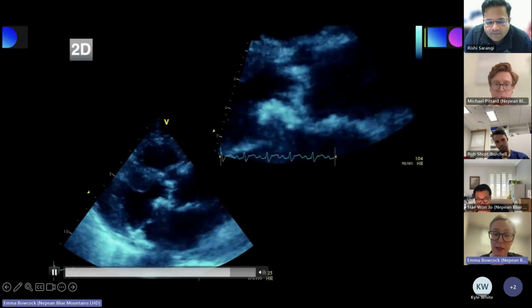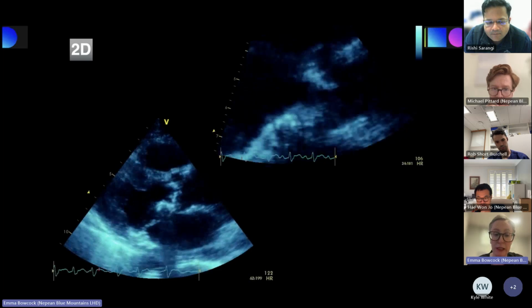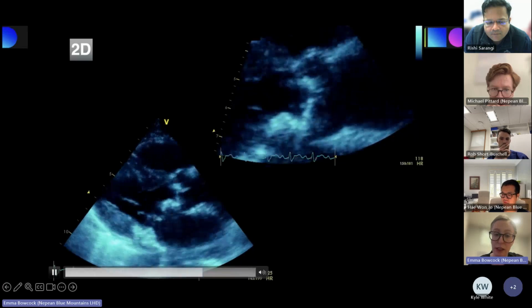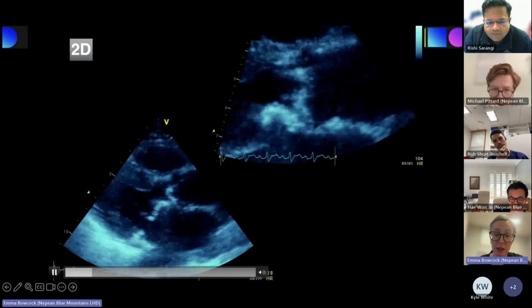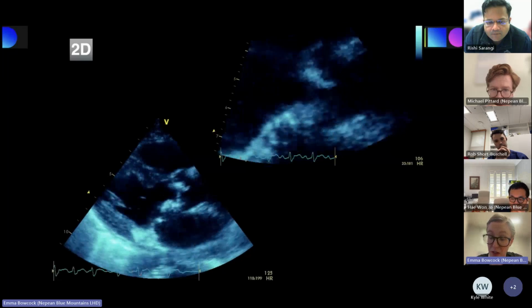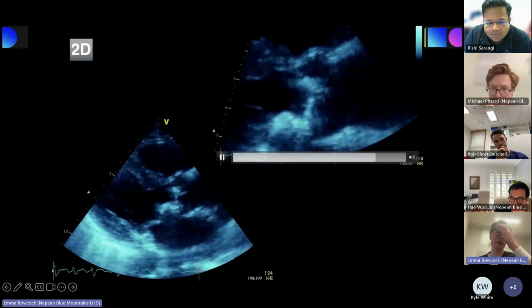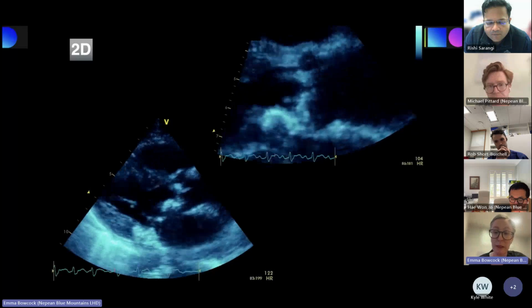But the mitral leaflets themselves seem to be opening reasonably well. The LV looks normal size, but possibly some increased LV wall thickness, possibly smallish cavity size, isn't it? And then this aortic valve looks moderate to severely thickened with moderate to severe restricted opening. And the zoomed in view of that just confirms all of that as well.